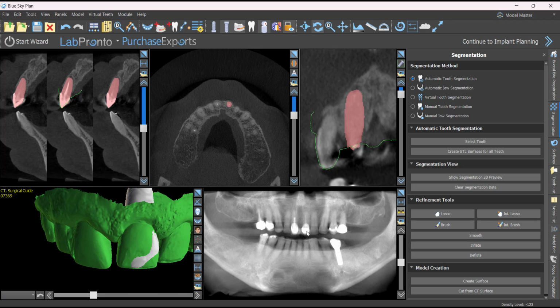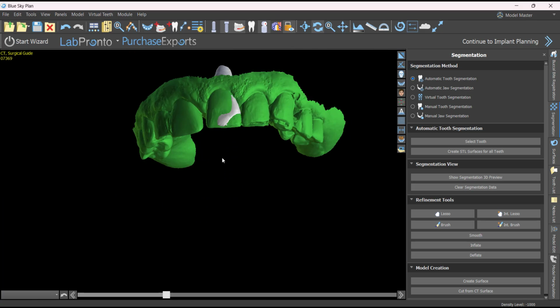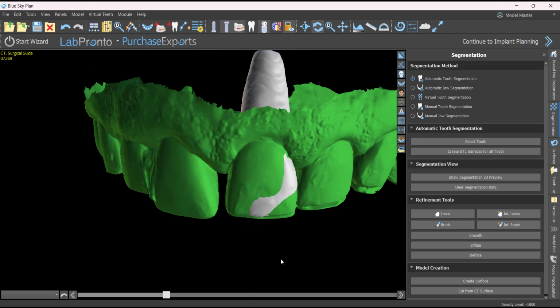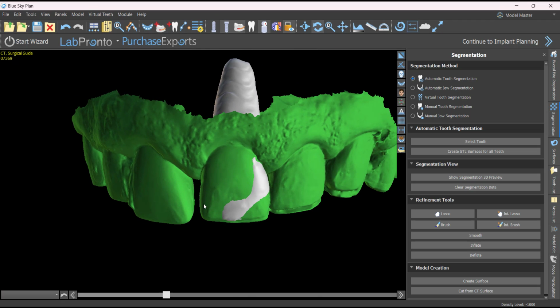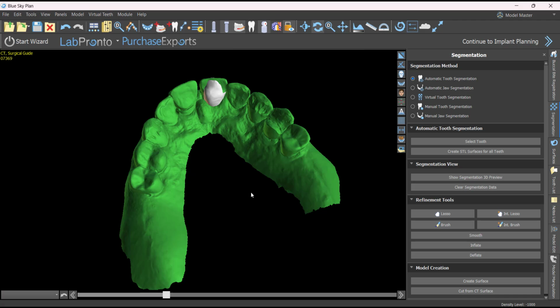All right, now given that this does have a PFM crown on it, I don't expect for that tooth to be perfectly adapted up there, because the scatter from the crown is going to make this not be as perfect. All right, now here's a bonus for this case. So let's say that you literally wanted to adapt this tooth where you've got exactly the clinical crown of this, like from the intraoral scan. All right, that's actually something we could do.